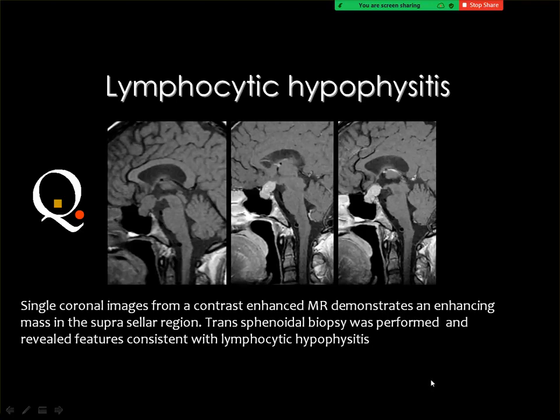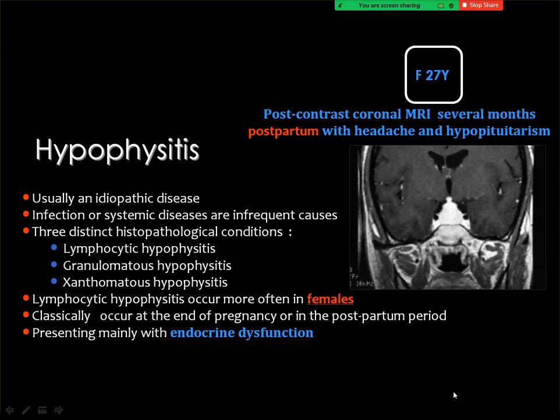In Langerhans cell histiocytosis, this is a child, and the appearance will go with histiocytosis. Also, you may see some of the osteolytic lesions in the calvarial bones. For lymphocytic hypophysitis, you should have this typical history, which is a female patient in the reproductive period with recent delivery, several months.